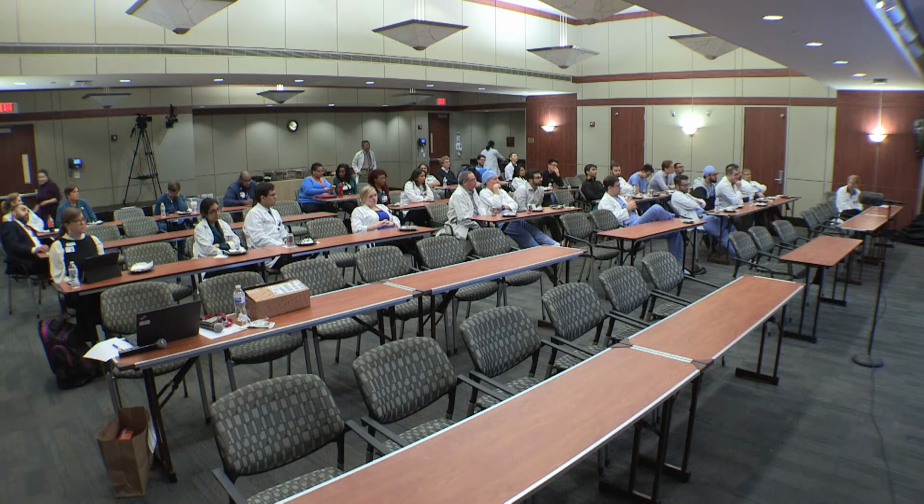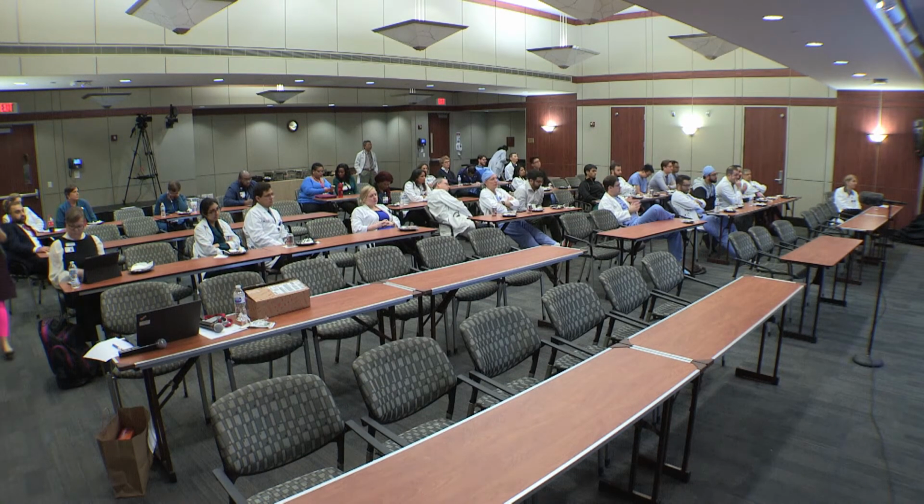And that's one of the things that we felt, in order to avoid any confusion when we have these referrals, just to be a little bit more conservative in the way we trace, and then we get very nice correlations. I personally wouldn't do it.